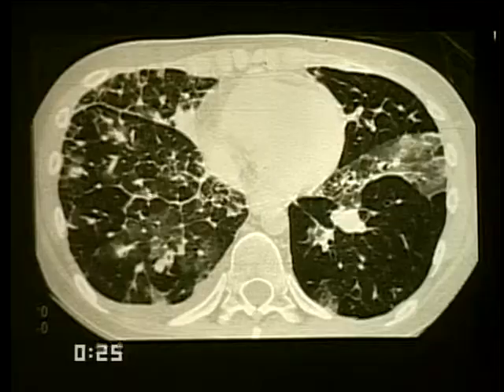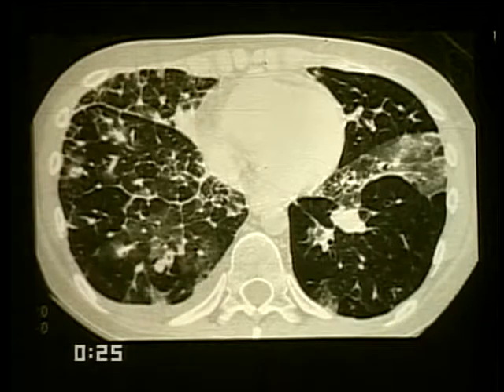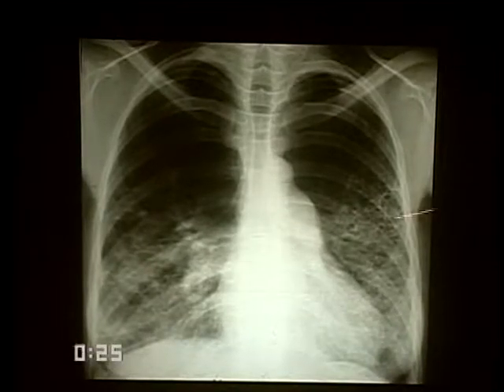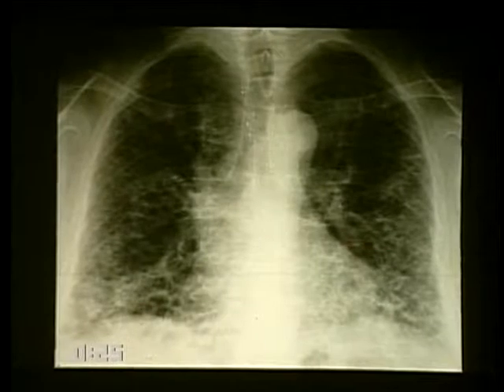Here again, we will see thickening of the septal interstitium and the septal interstitium coming centrally. In some areas, we will find thickening of the axial interstitium, narrowing the wall of a bronchus. Mixed connective tissue disease looks much the same as the interstitial lung disease of rheumatoid arthritis.